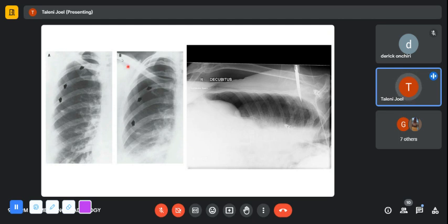Okay. The images to the right, to the left, is someone volunteering, or should I? I thought someone was. I think I can go ahead because it's similar to what Sharon has just reported.